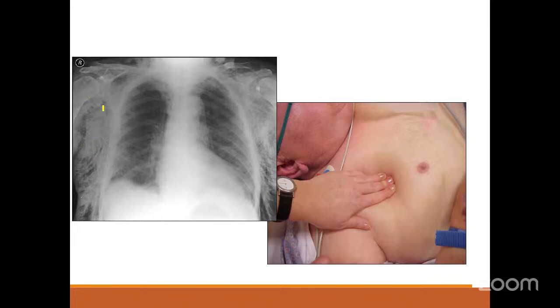Whenever you see something like this, always look at the bones, see if there are any fractures, or any trauma-related injury causing the air leak into the skin from the lungs. These people are very highly prone to develop pneumothorax. So whenever you identify any patient with surgical emphysema, evaluate further or keep monitoring to see if these patients have a chance to progress towards a pneumothorax.